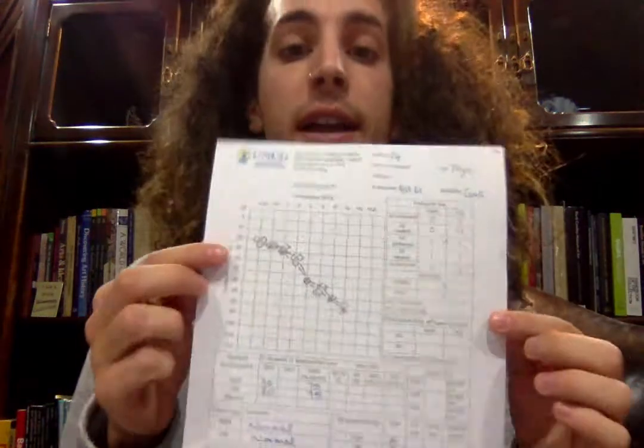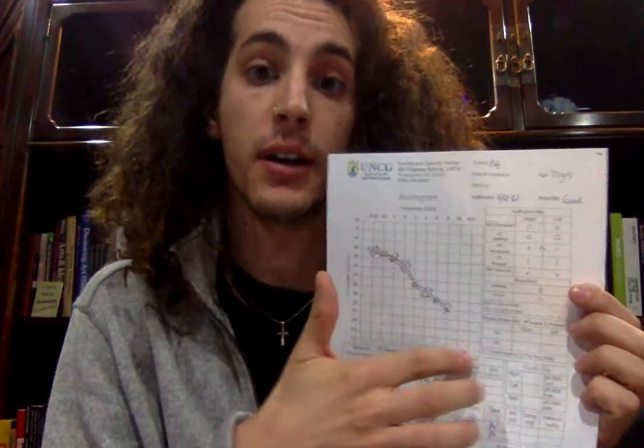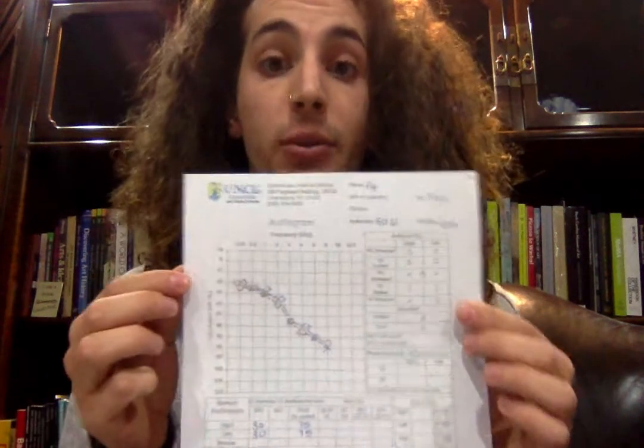Moving on to the audiogram, you can immediately tell that the configuration is sharply sloping. You can tell that through the way that both are tapering downwards. Beyond that, you're able to see that it's a pretty bilateral loss. So the left and the right ears are matching up to each other almost identically in most of the different hertz and frequency levels.